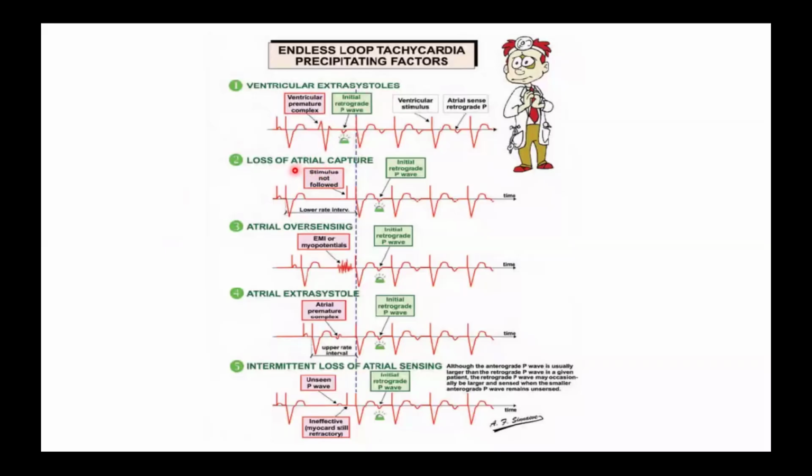Or maybe initiated by atrial loss of capture. Here, atrial pacing, no P wave, then V pacing, then retrograde conduction, as the atrium is not depolarized, and a retrograde P wave is noticed and starts PMT. Or atrial oversensing, which starts a sensed AV interval and then followed by ventricular pacing, and the atrium also is not depolarized.